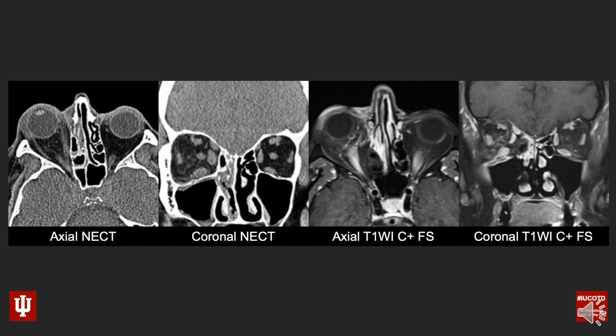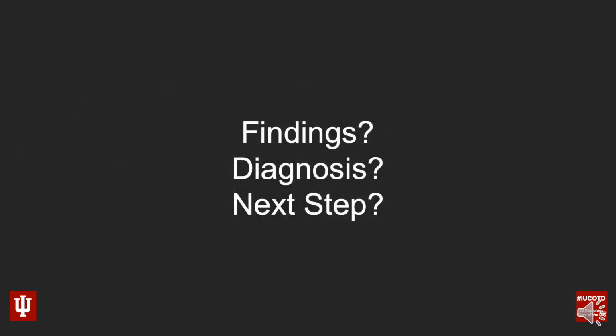So keep in mind that history, AML and facial pain. Look at these images. Try to put together what you think is going on here. Keeping those images in mind, what findings do you see? What's the diagnosis? And importantly, what's the next step for this patient?